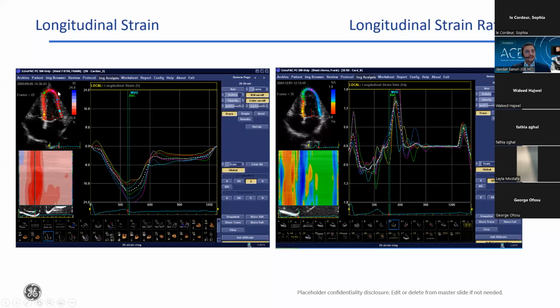And you can see the strain curved anatomical M-mode starting from the yellow here all the way around to the light green or light blue here, and that's from the basal, here's my cursor, from the basal septal, mid, apical, all the way to the basal lateral wall.